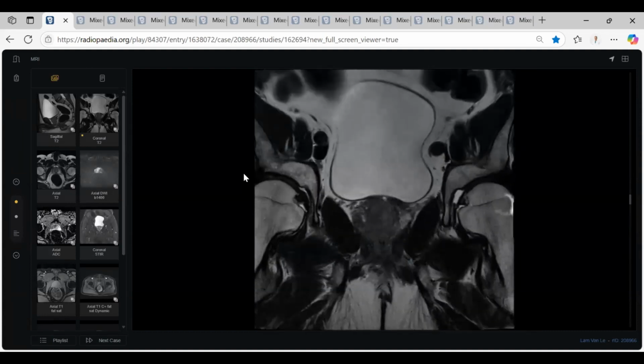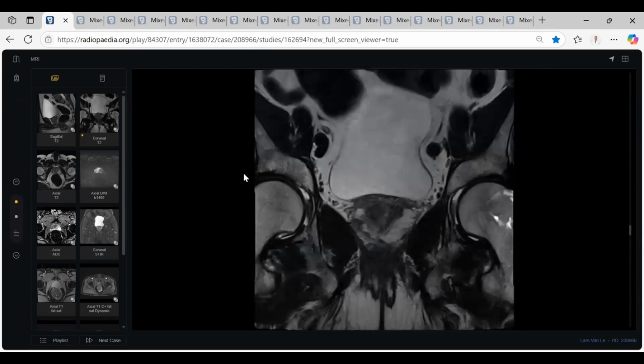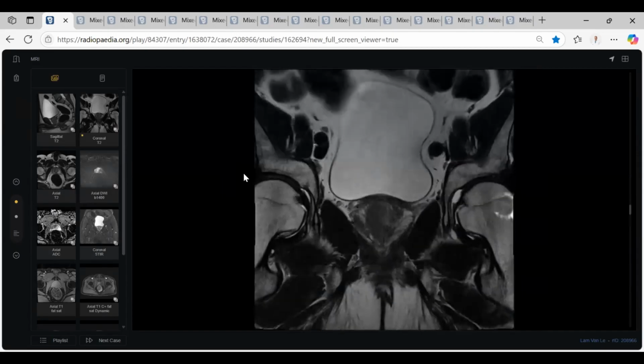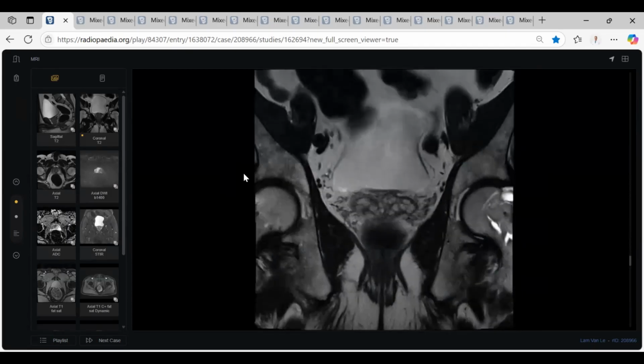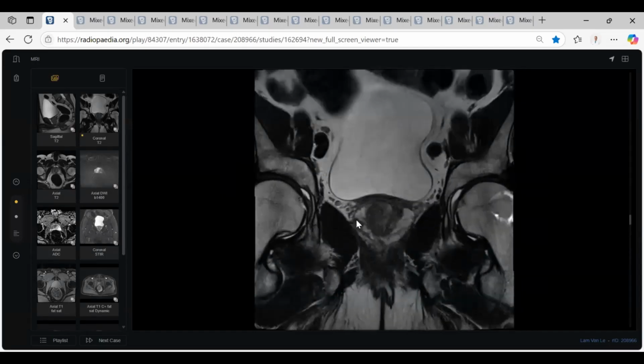Thank you, doctor, so much. You did very well. See, my colleagues, this is a T2 MRI prostate. Okay, not pelvis. It does take some pelvic organs, but this examination is dedicated for prostate. Second point, look here. At least there is a lesion here, and this is very dark. I think there is a sign called the charcoal sign.